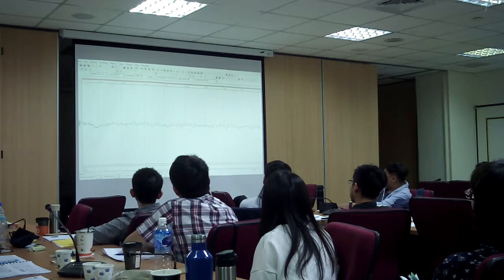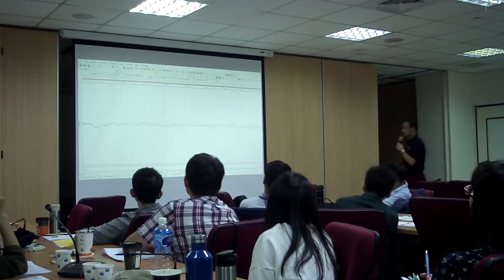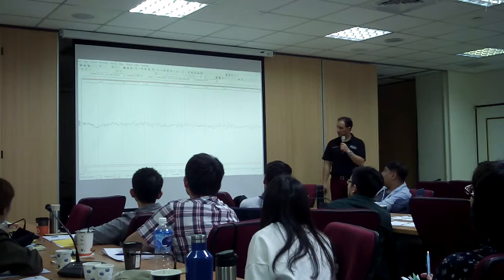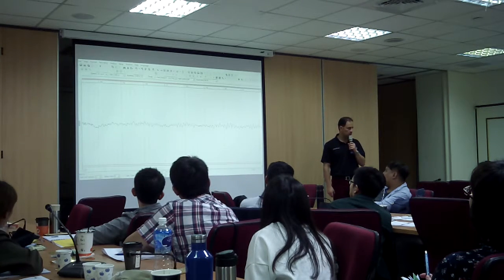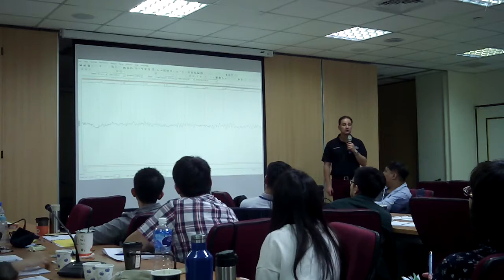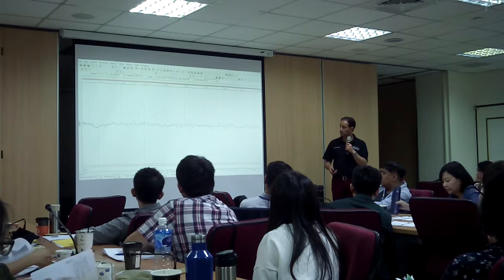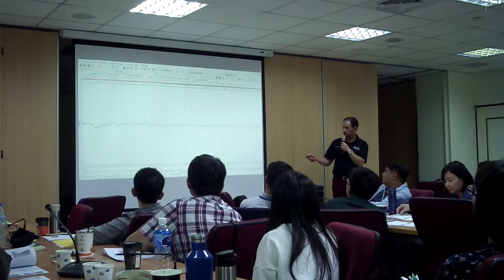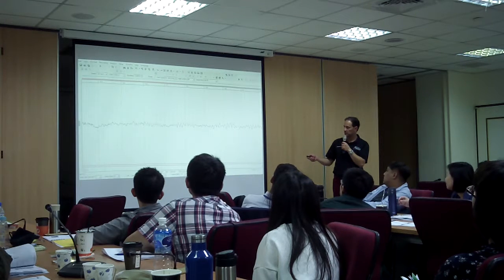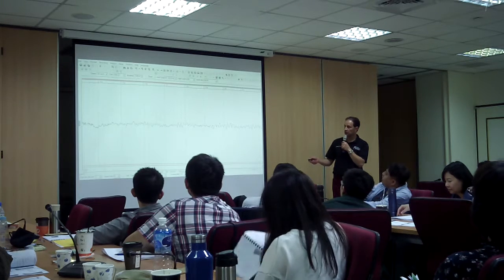So what rhythm is that? How do we know? How do we know if it is theta, delta, alpha? How many cycles is it? Let's count here. 1. You count it. 1, 2, 3, 4, 5, 6, 7. What's that? Theta. Slow theta, right?